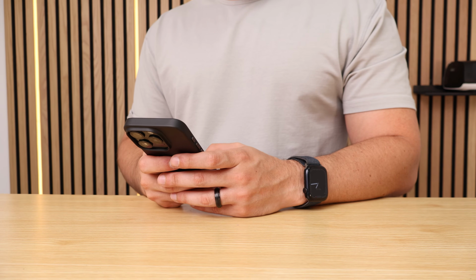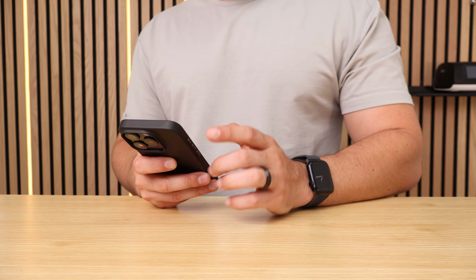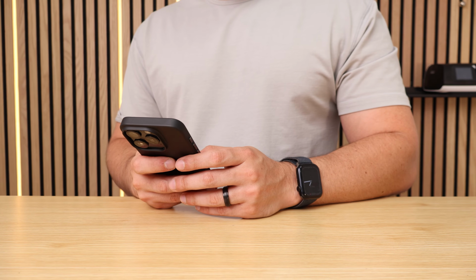Struggling to understand your CPAP data? The ResMed myAir app makes it so easy, and in this video, I'll teach you how to use it and how to get the most out of it. Let's go.